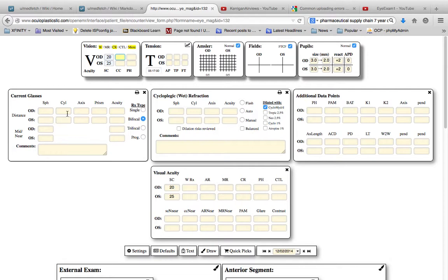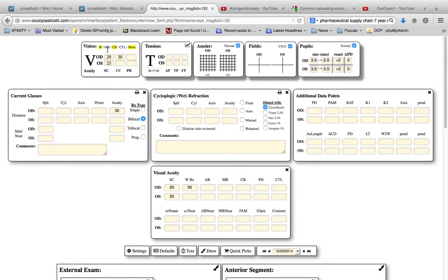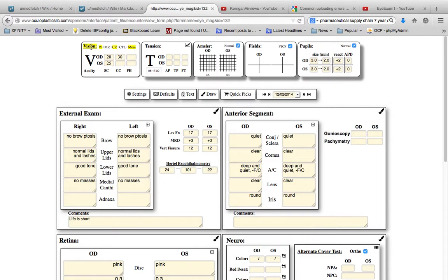If we have somebody whose current glasses have them seeing 20/30, the acuity is automatically there and on the summary page. Let's hide that. Oh, notice these came up when we opened the page, because that's how we closed the last patient. If we close this and refresh the page, this data will show back up again, because now that's your preference. All right.